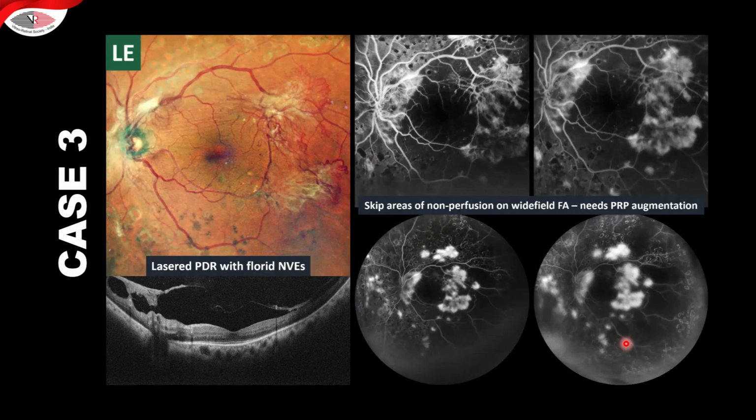This is a lasered PDR with florid NVEs that you can see. You see the laser marks here are probably still inadequate, and this tells you that you need much more laser and then to regress all these areas.